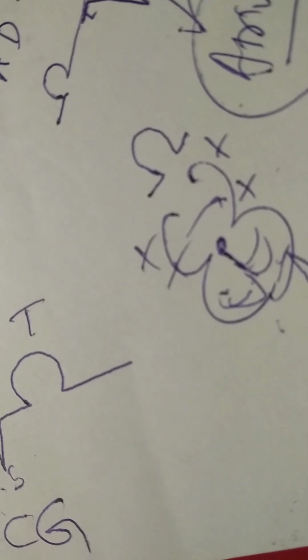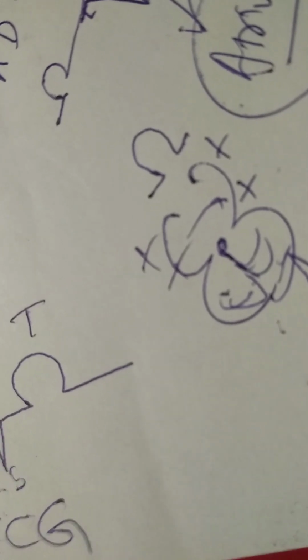While the impulse from the AV node spreads through the bundle of His towards the Purkinje fibers, the time taken is really minimal, meaning the ventricular conduction is really minimal. The time taken for the impulse going from the AV node, bundle of His, to the Purkinje fibers is very minimal. Therefore, the width of the QRS complex is also very minimal.